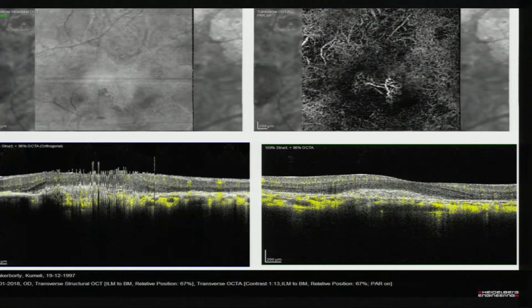Yeah, what is happening is when there is a scar, just adjacent to the scar, there is probably a dehiscence. So we are actually seeing type 1 choroidal neovascular membranes in many of these patients. To begin with, they may have very small microcysts in the retina. We have both groups of patients. Some we have treated, some we have not treated. Those whom we have not treated have progressed on to develop the fluid subsequently and worsening of the vision. Probably this helps to treat early and get better results. That's right.